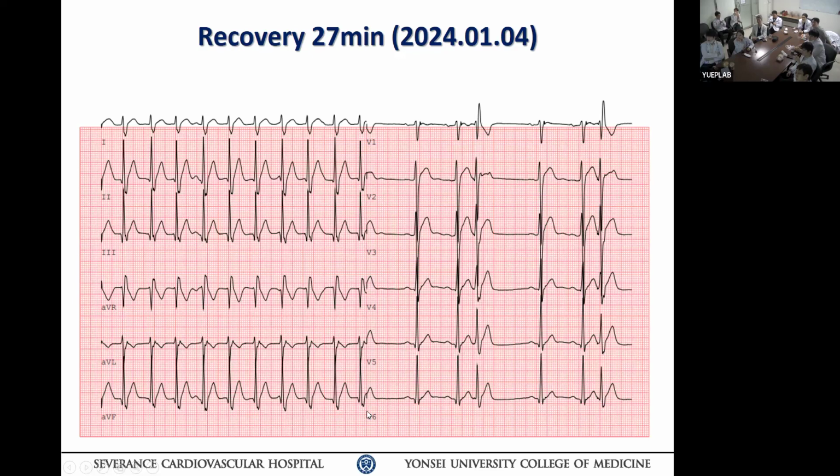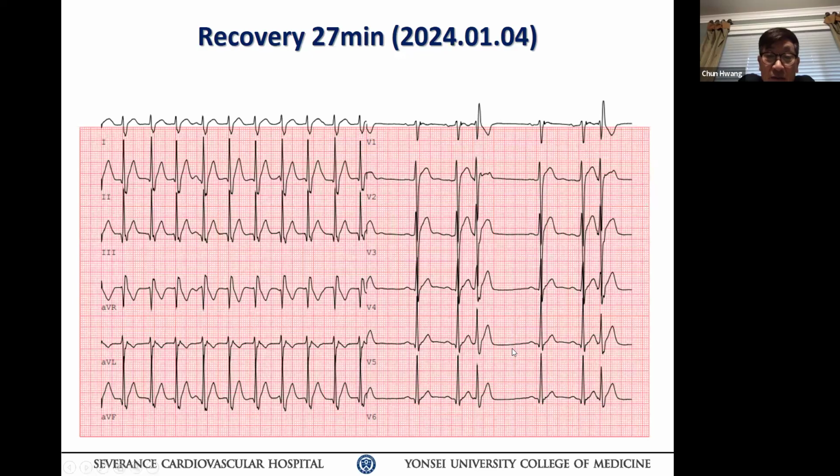It looks somewhat similar, but it may not be quite similar. It will be interesting to see what the baseline looks like. But anyhow, I think this is basically calcium channel blocker sensitivity. The patient is young, otherwise a healthy person who had documented posterior fascicular VT ablation, but the initial presentation also showed an anterior fascicular or septal fascicular VT pattern. Okay. Anything else?